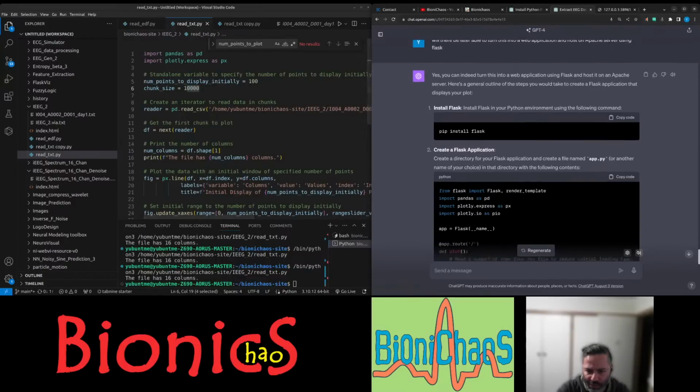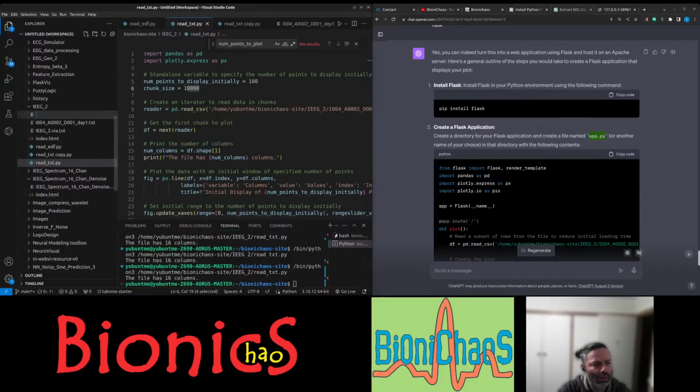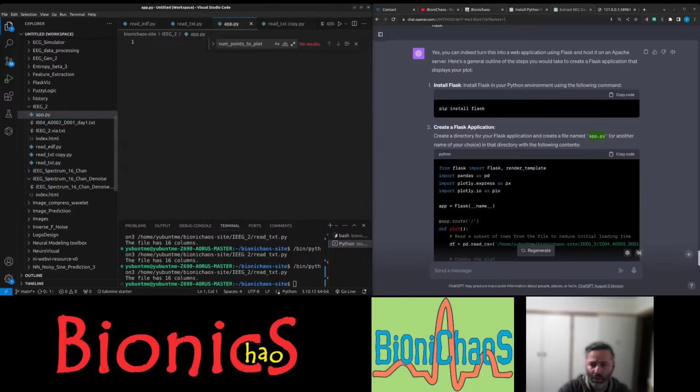Install Flask. We have Flask installed. Yes, we want an app.py. This should be in the main folder.